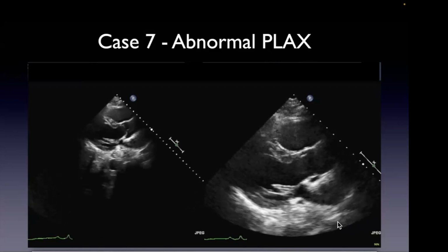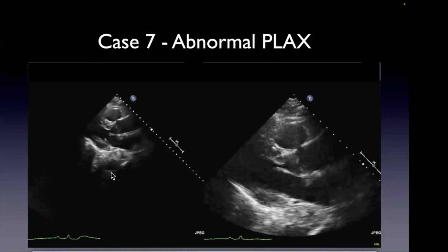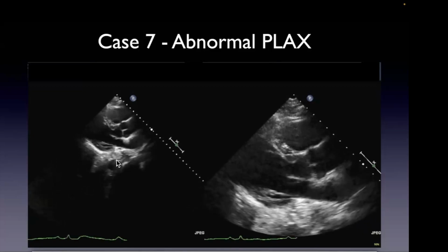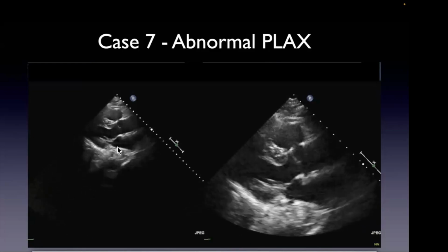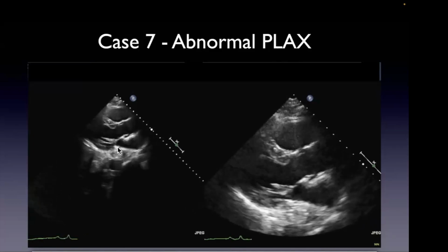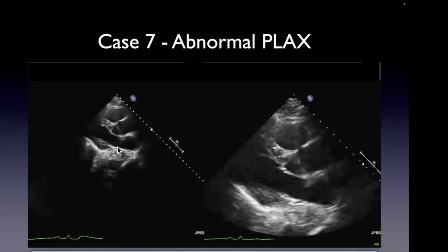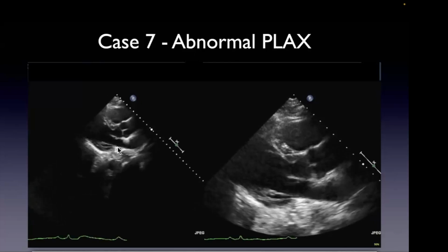Is it anterior to the descending aorta? Yeah, so is that the aorta here? Yeah. And if that's the aorta, what's the structure between the aorta and the left atrium that we put probes down? Yeah, this is the esophageal stent.